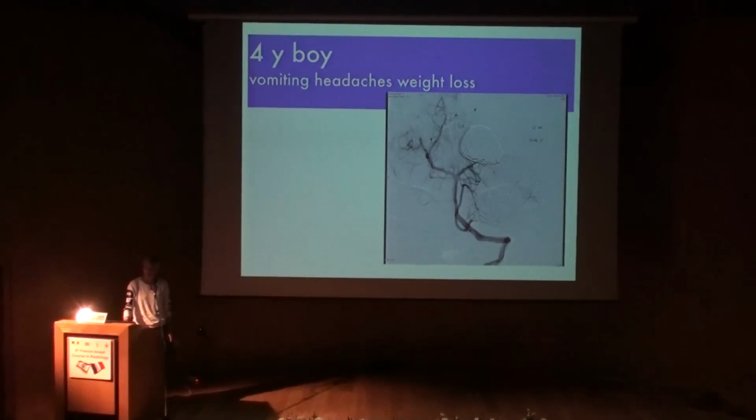You see that there's no enhancement here on the PCA from the vertebral, but he got PCA supply from the carotid, and he was fine with no visual deficits.